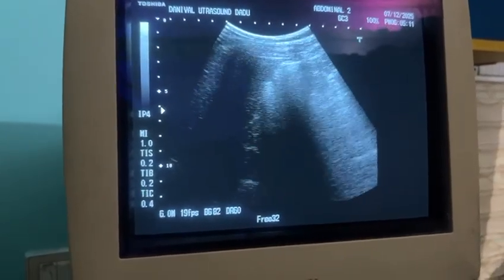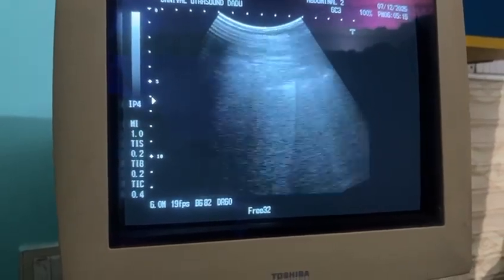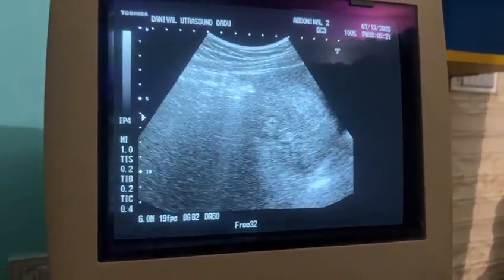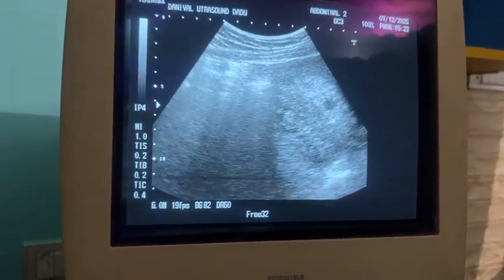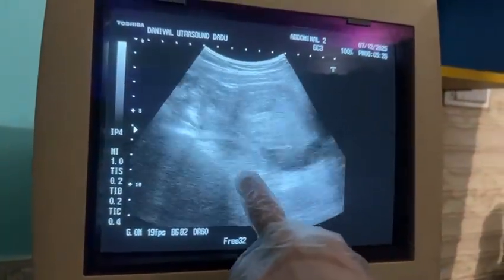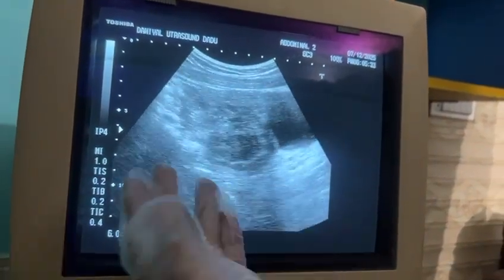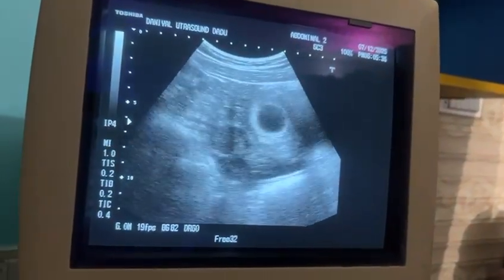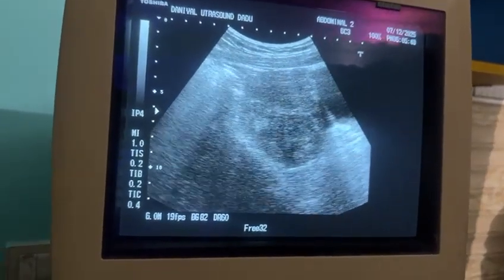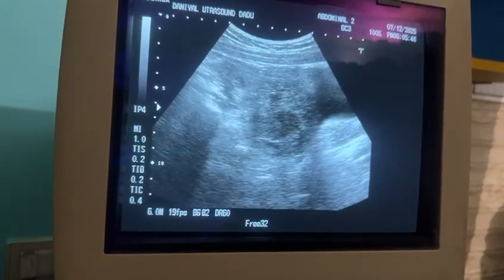So further, this fluid is indicative of hemoperitoneum, or blood. And sometimes you can find the sac in the area which has ruptured, but in most cases there isn't any sac, and an amorphous irregular mass is found.